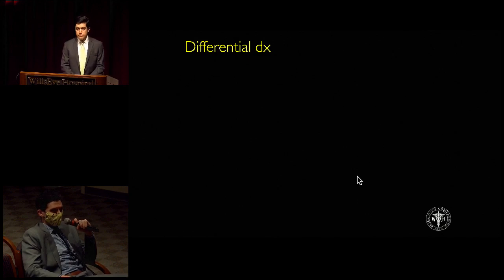Other things you could think about would be Valsalva retinopathy, which can cause multi-layered hemorrhages. Leukemic retinopathy as well can do this, though it would be unusual to be unilateral to this extent. Another thing to think about would be Terson syndrome, so get a history of any head trauma or subarachnoid hemorrhage. That can also cause a picture like this. And then I think retinal arterial macroaneurysm with some breakthrough hemorrhage into the vitreous would be a high consideration, especially given that intraretinal component. Excellent.